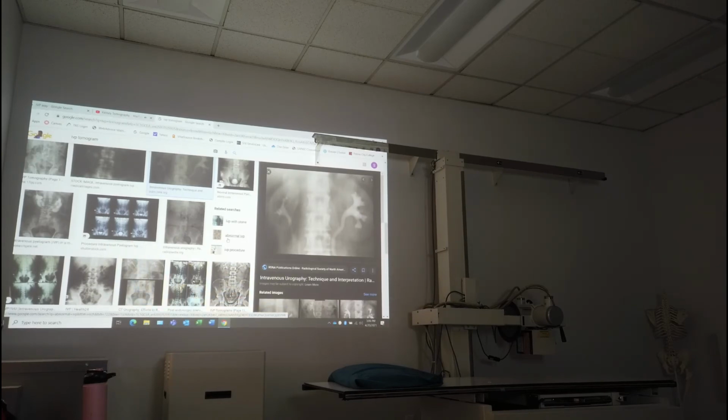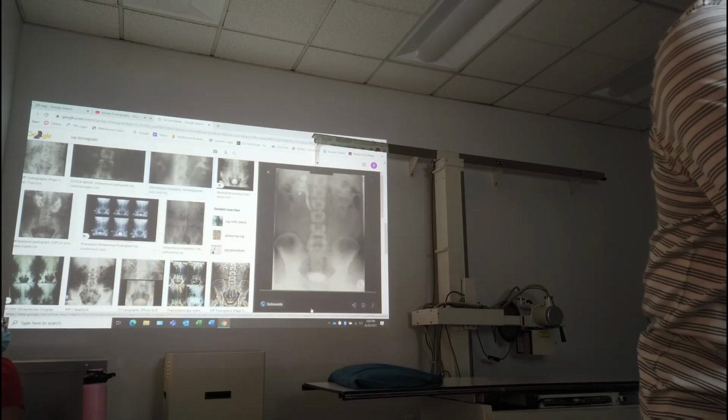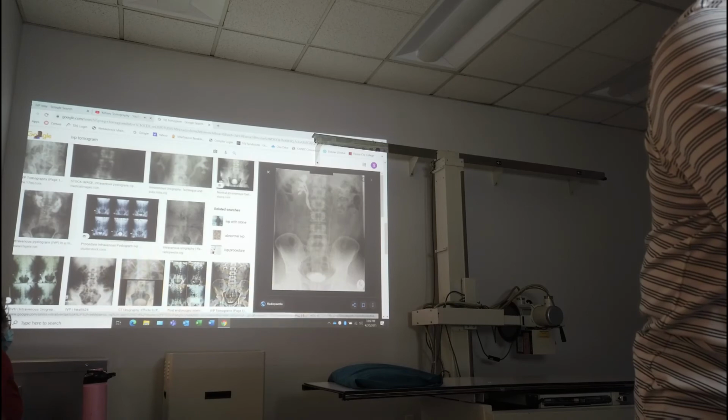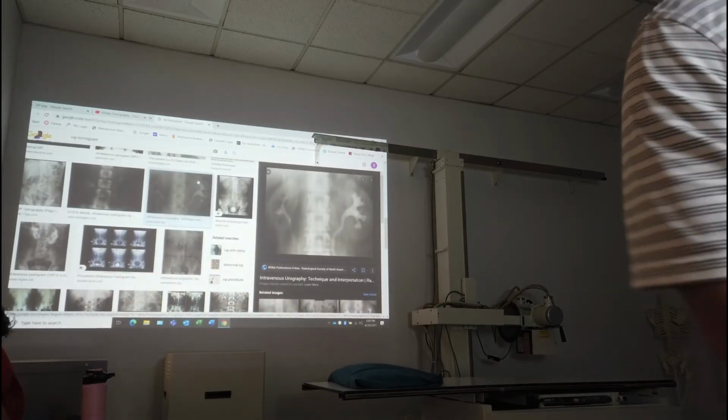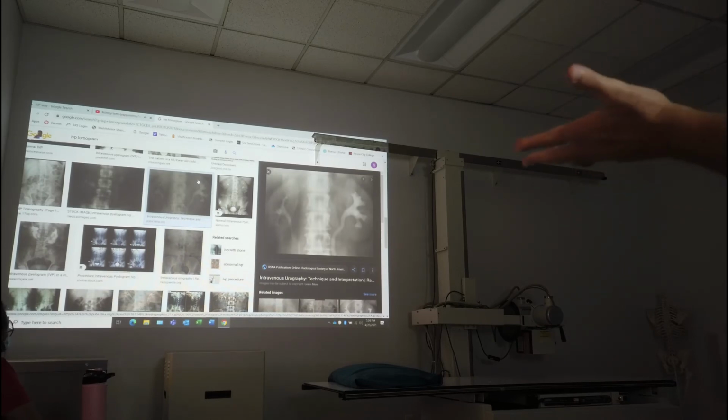But what you don't see is like intestine. You don't see any gas. You don't see any structure that you normally see that's on top of the kidneys. So that's kind of like the beauty of it. If you go down here, I can see this image down here. See how you have all the gas and the poop and all that stuff? But you don't see it on here. That's because it's using motion to take those structures and throw them in different areas as it's moving. And it basically looks like it's fog that creates the motion. Pretty sick though.